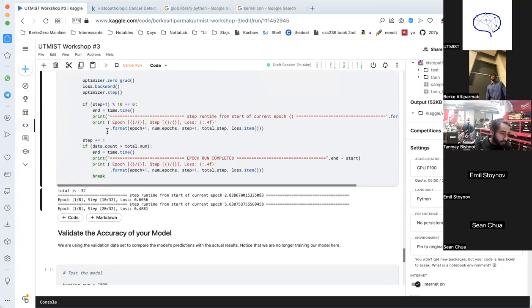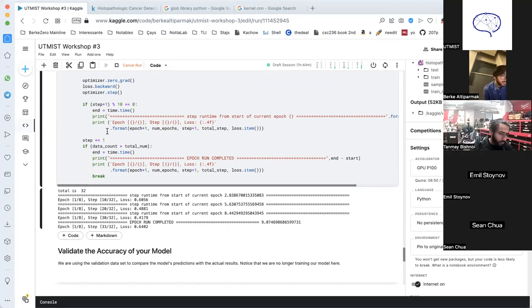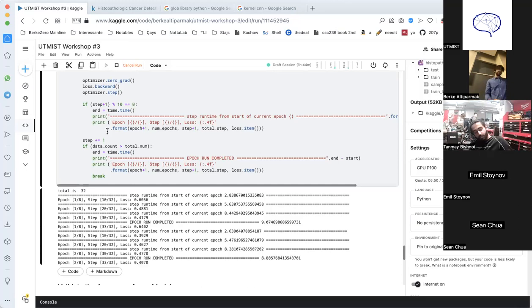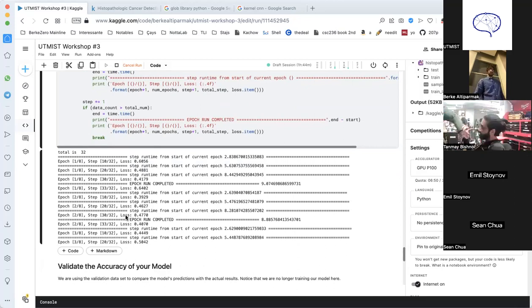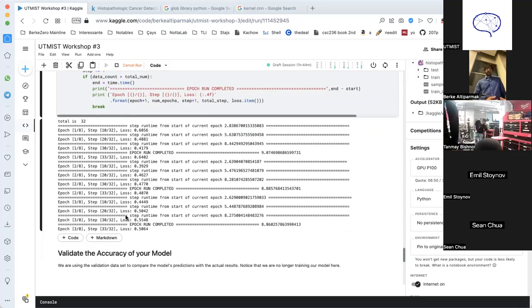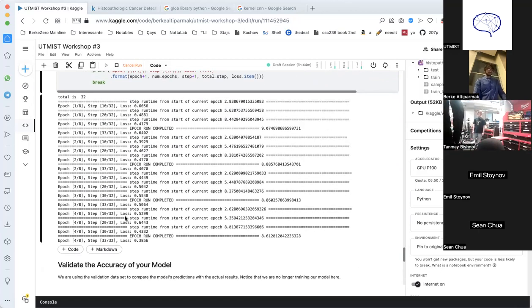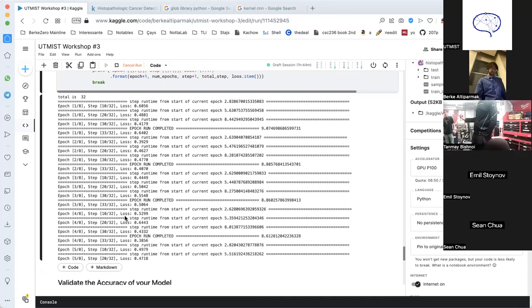We start running our model. As you can see, we have our training loop, and one epoch is already completed. So this iterates 8 times, and each iteration we have different step sizes. Our batch size is 32, and we can see how the model actually works. We can see the loss value and its range. It is not strictly decreasing, but it is decreasing.